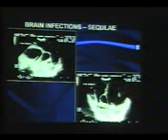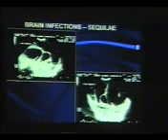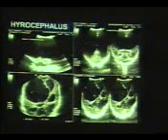This is a follow-up case of tubercular meningitis, where we can see a dilated ventricle, shifting, distorted anatomy, and resulting pressure on the brain parenchyma, with thinning of the brain parenchyma. So these are the cases that immediately require a shunt, so that we can prevent gross damage to the brain parenchyma. Not only that, we can see the gross hydrocephalus.